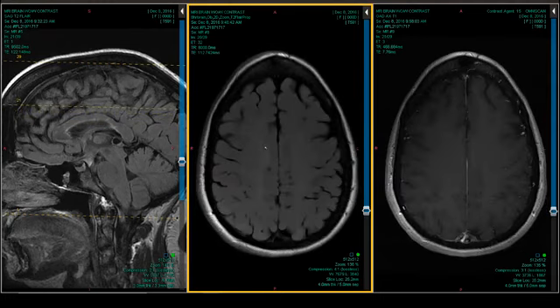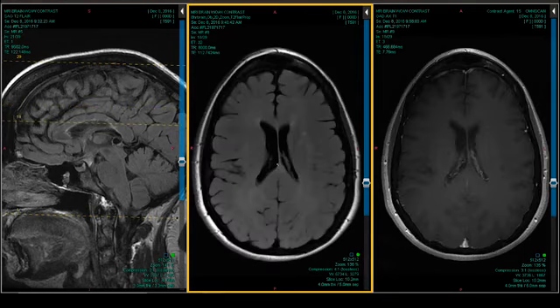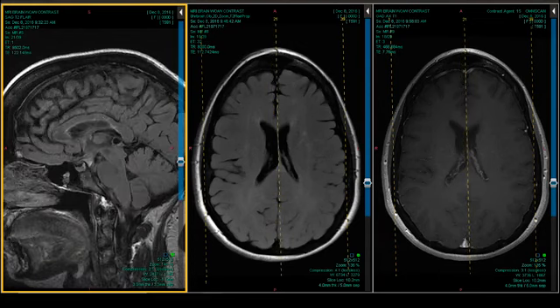Their callosal predilection isn't as conspicuous in the axial projection, and this sagittal value proposition of seeing the right angle demyelination in the callosum was really first described by the esteemed and recently deceased radiologist Bill Bradley, an original pioneer in MRI. And this case, I think, displays that.